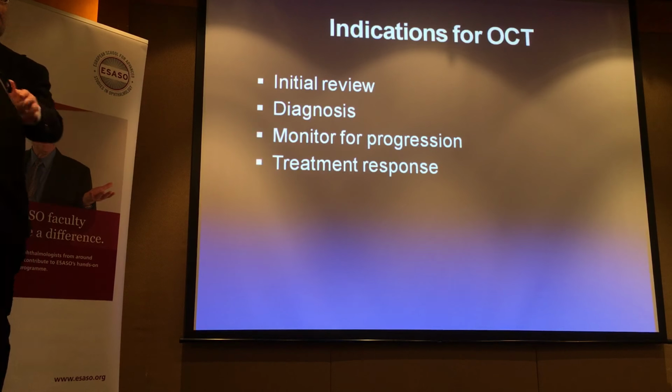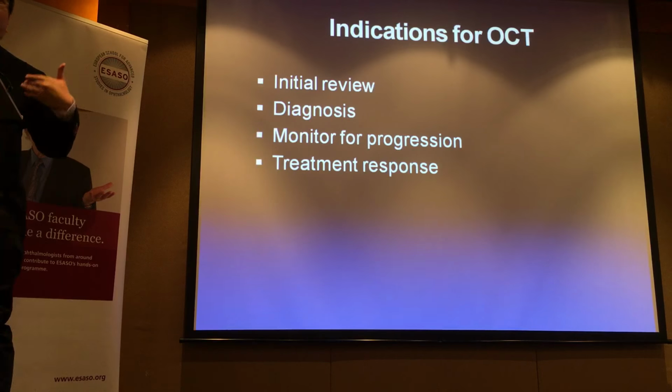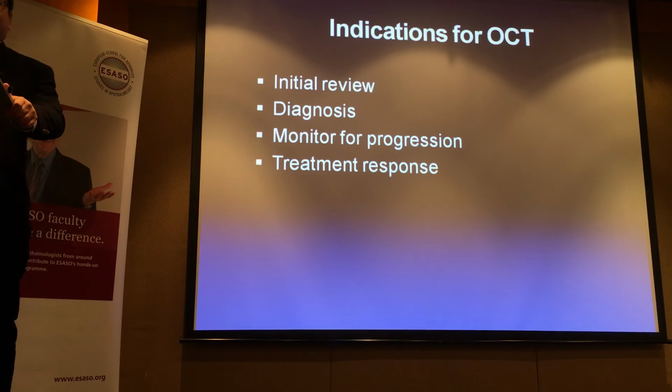This goes to the next point about monitoring for progression. If you don't have a previous OCT, you can't tell what today's OCT is like relative to the previous visit. You can go by clinical impression if you remember correctly, if you document it accurately, but you won't have any scan to compare against. Right? So very important if you want a baseline. If you want to compare, you need a baseline. And of course, treatment response is very, very important.